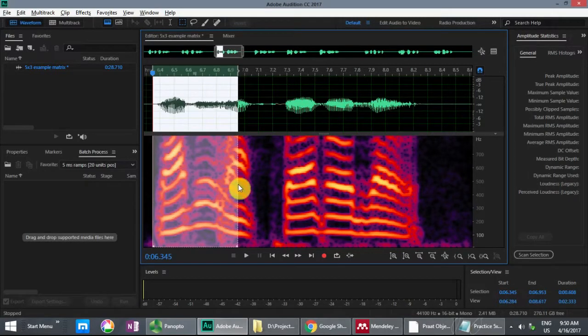So this is also a point where I diverge from the general instructions given in the ICRA paper. The ICRA paper suggests that you could make the edit right along the co-articulation. But if I edit in the middle of the central vowel or the nucleus of the second word, the edits are going to be more seamless.